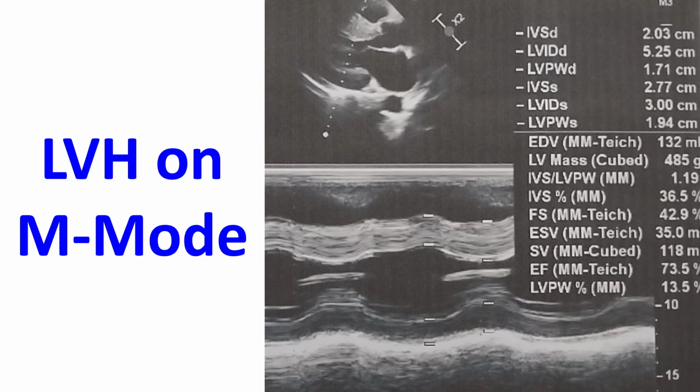This is one of the older modes of echocardiography known as M mode or time motion mode or TM mode, currently used as M mode only. In an earlier era, it was used for evaluation of valvular heart disease like mitral stenosis, where a specific pattern was noted on the mitral valve echocardiogram.